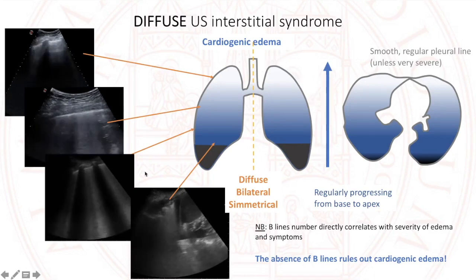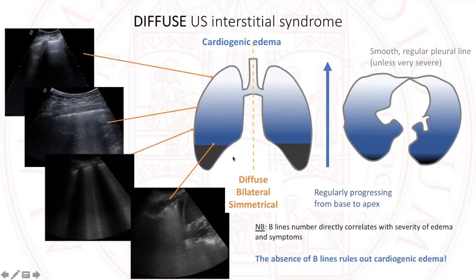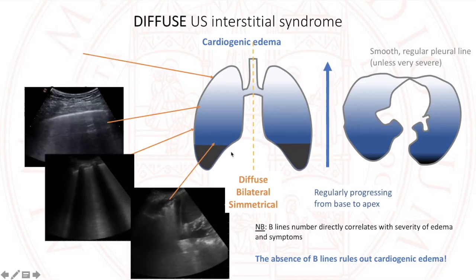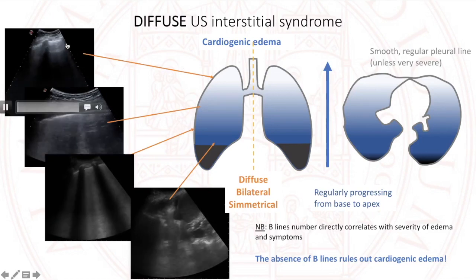As you see in this picture, the base of the lung is atelectasic, since there is pleural effusion, which is very common, and very frequently actually bilateral. So fluid effusion, severe B-line, severe interstitial syndrome at the base, which becomes less severe as we go towards the apex, which could also be completely normal, as in this case.